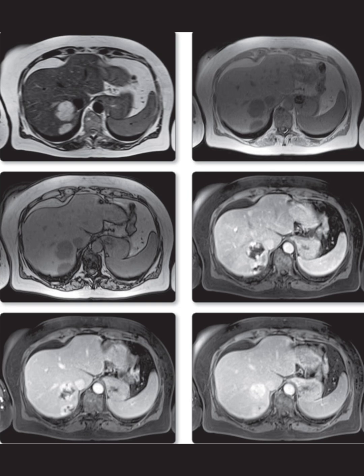Certainly. Let's delve into the details and ensure we cover all aspects thoroughly, including the diagnosis and any additional information from the provided images. Okay, let's walk through this interesting case together. We're examining a series of axial MRI images of the liver, all captured at the same level.